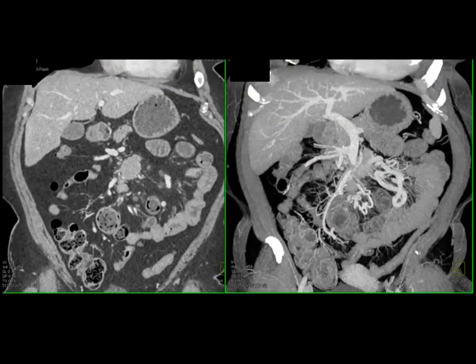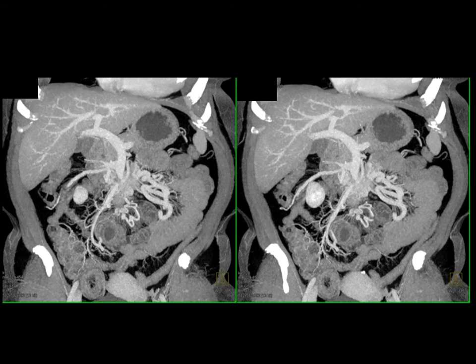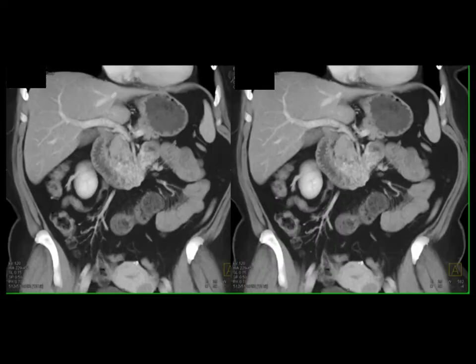You now see the mass and the multiple masses. You see the desmoplastic reaction. You see the desmoplastic reaction encases and occludes the patient's SMV. One of the things with carcinoid tumors, the mesenteric mass commonly involves the SMA and the SMV, causes occlusion, and in this case, extensive collateralization, very nicely shown there.